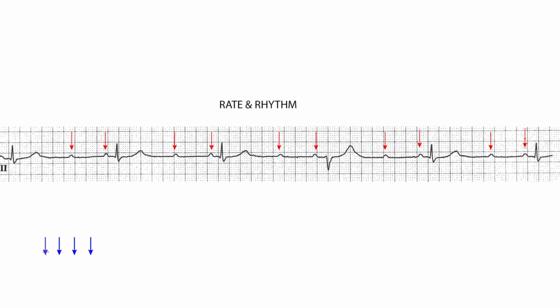Okay. Now, as far as the QRS goes, right, that's the QRS. These are the blue arrows. I was nice enough to throw a couple of different colors at you instead of magenta. You're probably getting sick and tired of magenta. All right, so let's get to it.